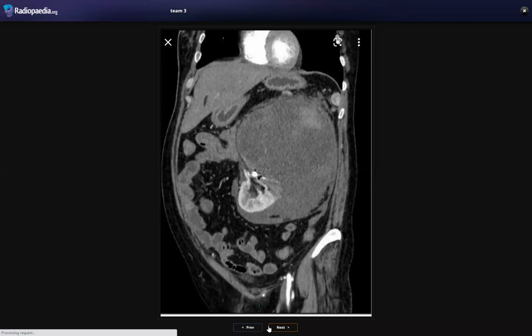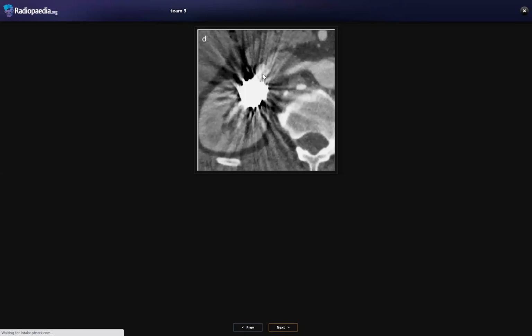But this, do you know now? This one may be clear also here. From the clips and the endovascular coils, yeah, sorry. Coil embolization, okay. So keep in mind for simple things in intervention, just the basic things in intervention.